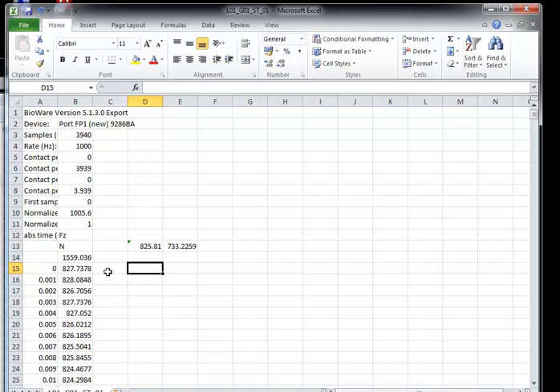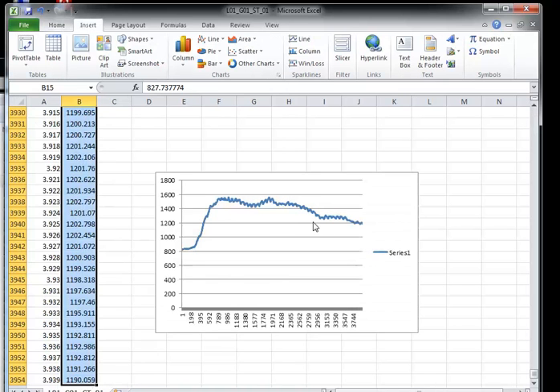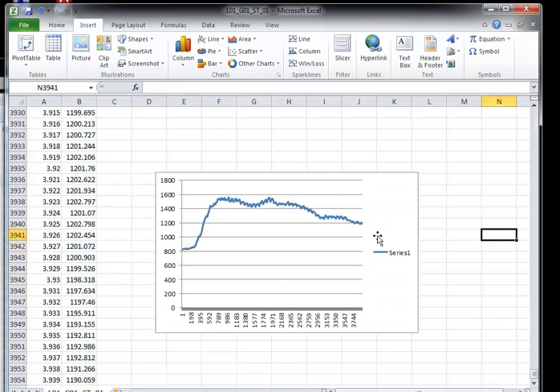So we've calculated a peak value now, but we may want to look at other variables such as the rate of force development. Now to do this, we really need to look at the graph we made earlier, or if you need to make a graph, highlight the data, make a line graph. And you can see it's tricky to identify where the peak starts. If you're looking at rate of force development and various other variables, you'll need to know when you actually consider the squat to start.